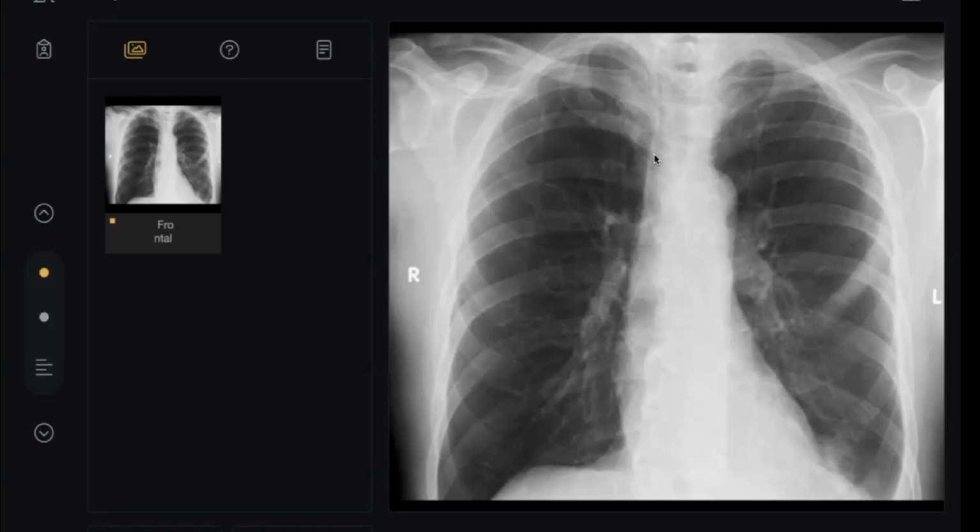In an elderly patient, this inhomogeneous opacity, mild effusion, and mildly sclerotic rib make me concerned about an underlying mass lesion, could be bronchoalveolar carcinoma. So I would like to proceed with a CT thorax with IV contrast.